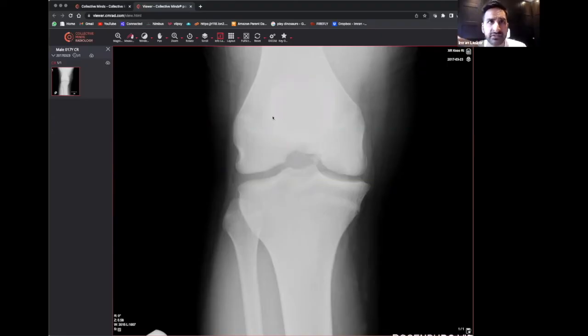Now, I'm going to throw out there, sometimes some people may see what looks like a radiolucent line sitting over there. What would anyone call that if you had a radiolucent line sitting on that patella? Because I've actually been called about this a few times, and sometimes what you have is a bipartite patella, because you get different ossification centers, right? And sometimes you get stippled ossification, so you don't get one, you get multiple partitions. So it doesn't always ossify in the right way. Someone's picked it up nicely. Well done for picking that up.